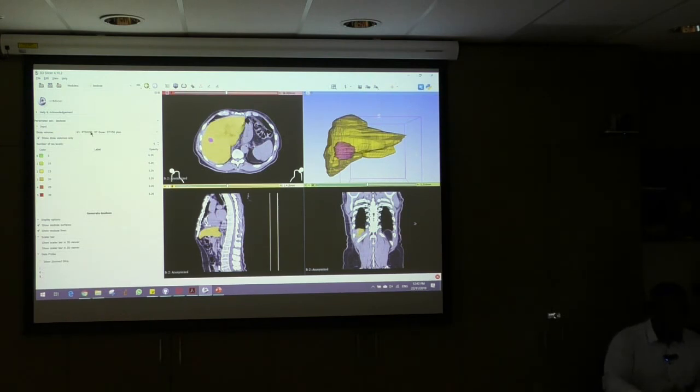First, you need to select the dose volume for which you want to compute the isodose distribution, and you can then select the amount of levels of the isodose. We'll stick to 5, and then you can change the gray value or the dose value for each level. The prescribed dose for this particular case was 45 gray, so we'll start with 60 just in case, and then we can change the values of the levels as we wish.